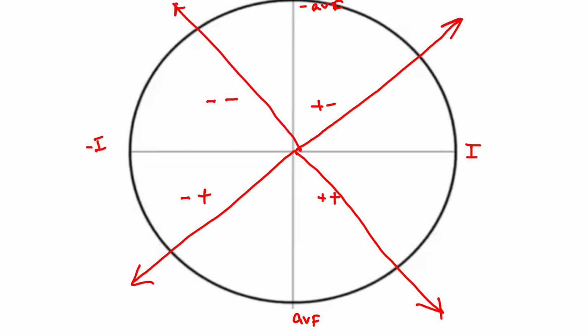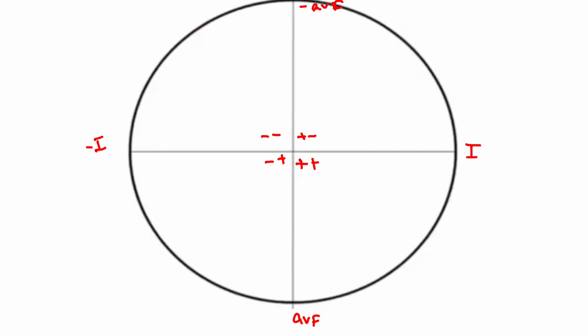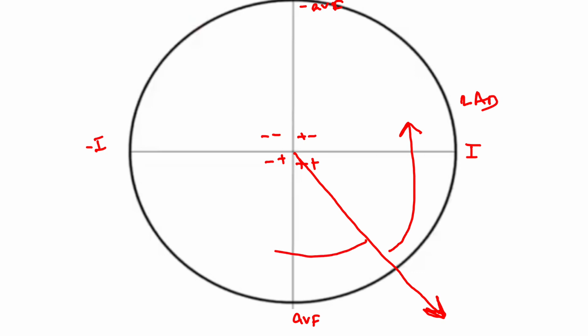So when lead 1 is positive and AVF is positive, the direction of the vector is in this direction, that is towards the main left ventricle. So this is the normal axis of the heart. We say the axis is normal when lead 1 is positive and AVF is also positive. If there is deviation of this axis towards the left, we call it left axis deviation, and if the deviation of the axis is towards the right, we call it right axis deviation.